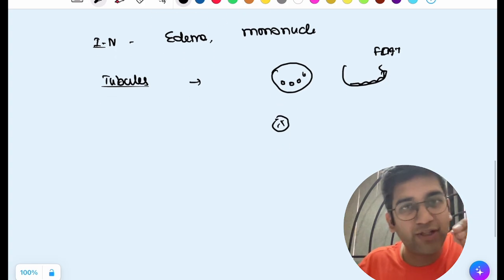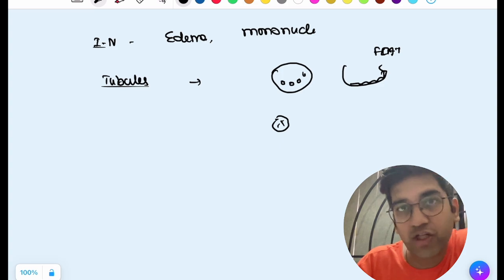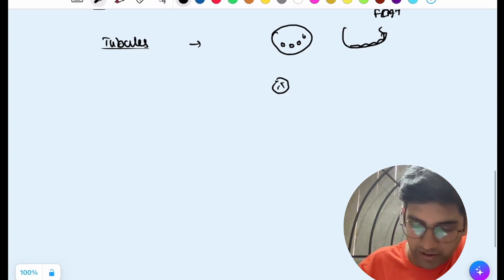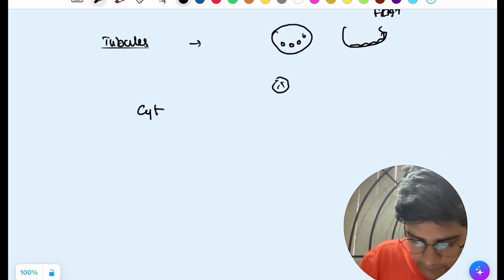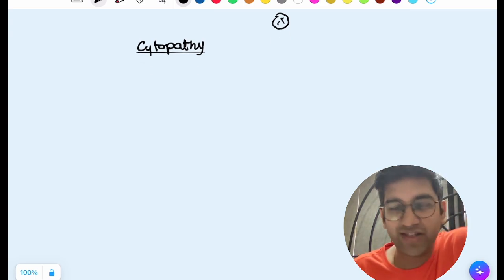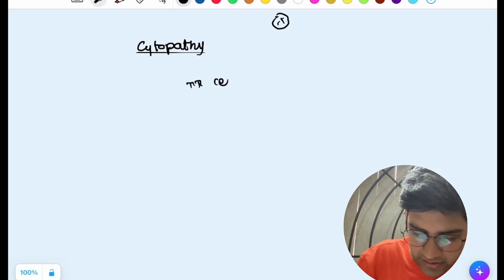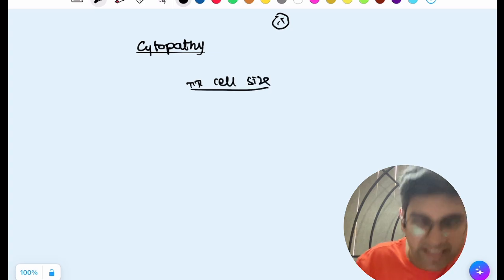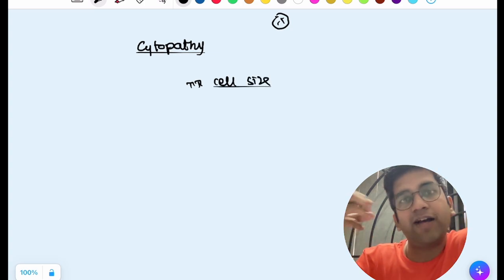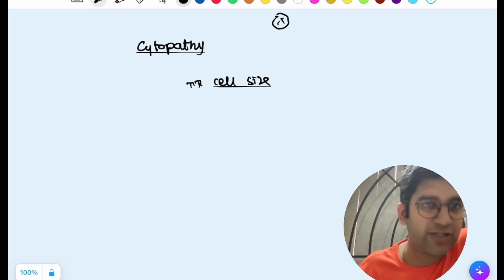So when you look at the tubular epithelial cytology, the cytopathy which is very classical for a case of polyomavirus nephropathy might actually be absent in the early stage of infection, right? So when you take the tubular cytopathic effects, this is what actually tells us, okay, I'm most likely going to deal with a polyomavirus, right? So first is cell enlargement. Cells will definitely be enlarged, so you'll have an increase in cell size. Cellular enlargement is by default the characteristic finding, because imagine a virus coming into a tubule and replicating in it. So obviously by default the cell has to increase in size.